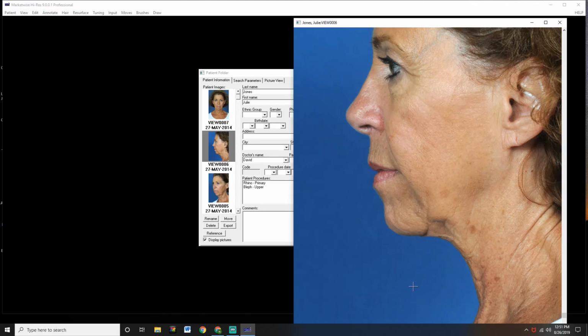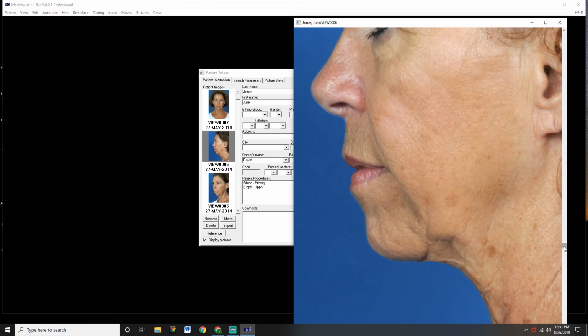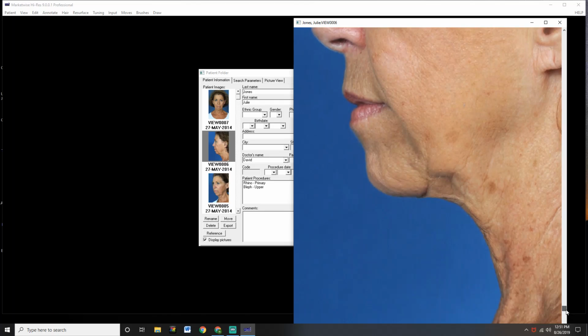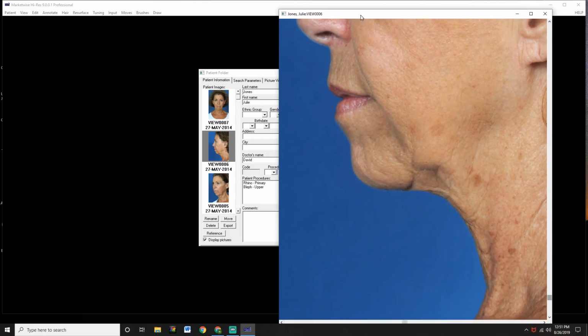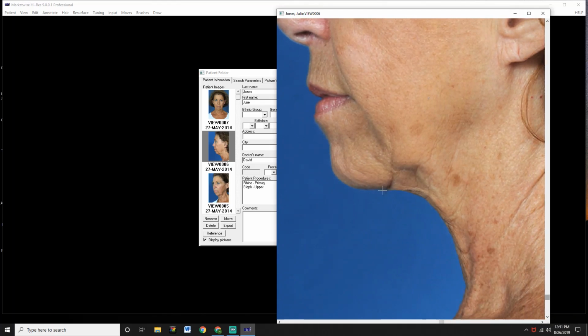Now, I've pulled things probably fairly close to where I want them to be. I'll probably make some more adjustments, but I want to work in closer. So I'm going to hit my End key. Now, I'm going to scroll this scroll bar down because this allows me to see the area that I want to see easily. Okay, I can see right here there's a little bump I want to fix. I'm still on my Morph tool. I want to do a little bit sharper angle.